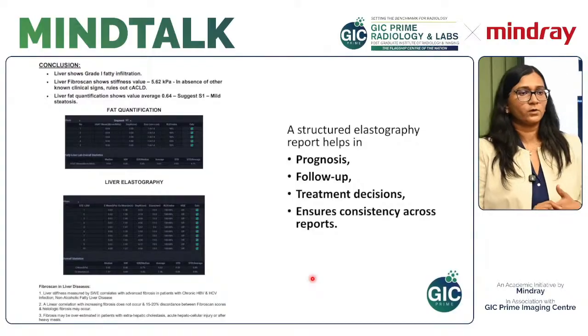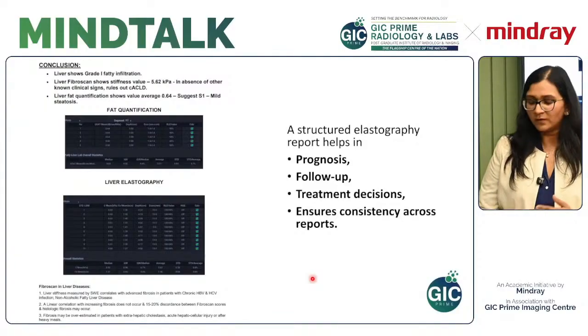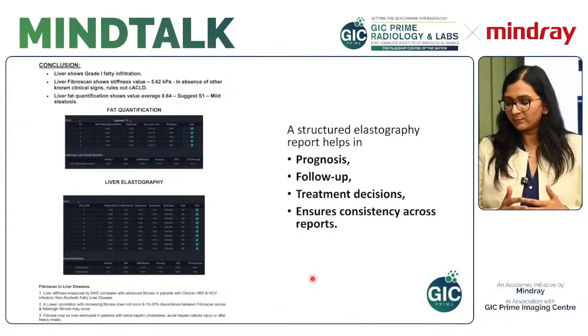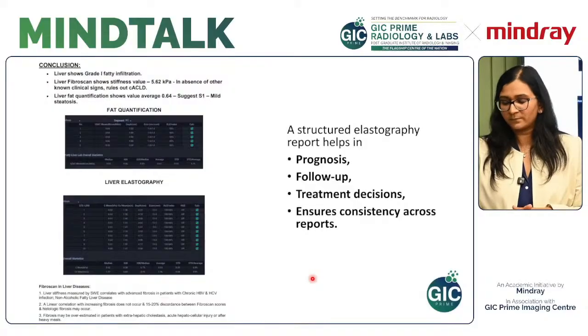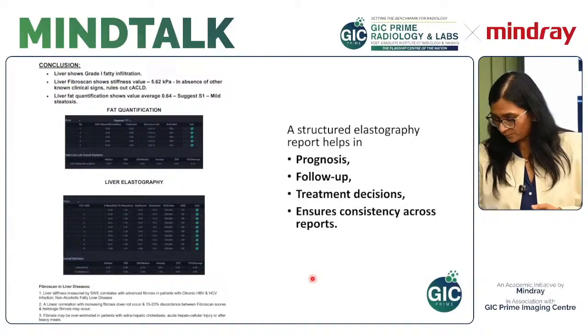And finally, we have concluded the case by showing that the patient has grade 1 fatty infiltration, S1, that is mild steatosis, and no risk of compensated advanced chronic liver disease. Structured elastography reports help us in prognosis, follow-up, treatment options, and ensure consistency across reports.